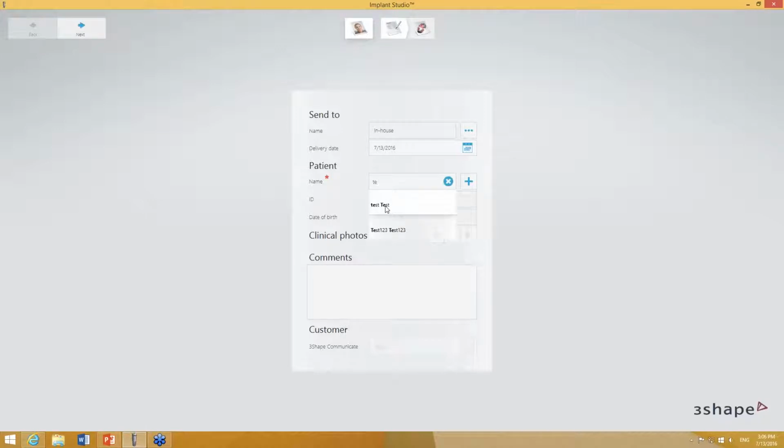I believe the best analyzed patient in my system will be the test patient, and I believe that will be the absolute minimum information that I need to select, since there is a green tick appearing on the order form in indication settings. The minimum has already been set. That's why I will go further on.